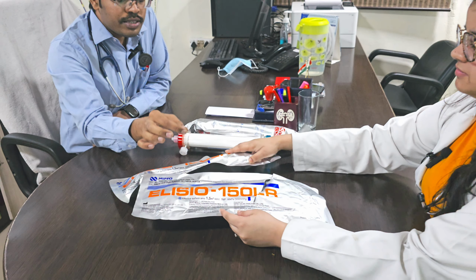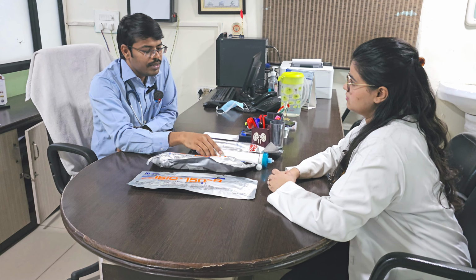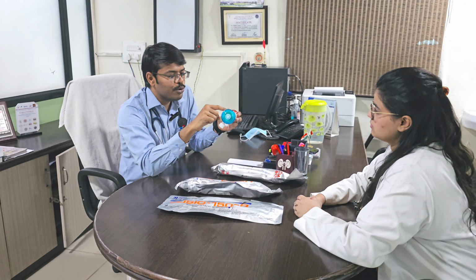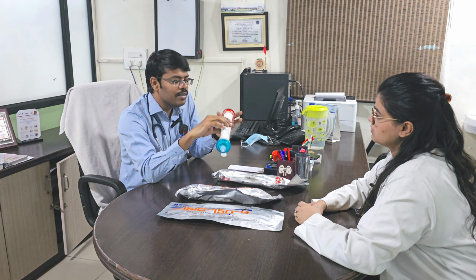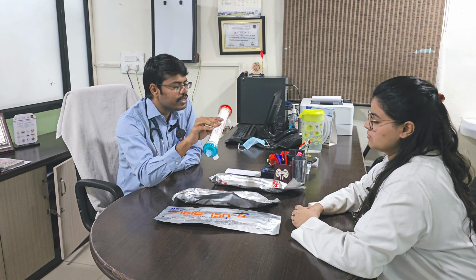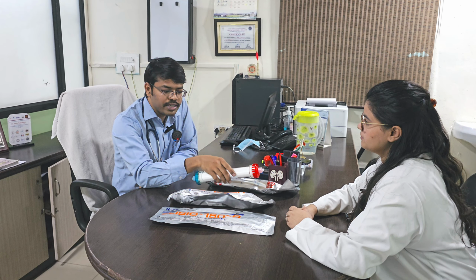Then an important question you might encounter here is: what is the other name for the dialyzer? It is also called a hollow fiber artificial kidney, because it is hollow and contains multiple fibers. So that is why it is doing half of the function of the kidney, mainly filtration and excretion function. So that is why it is called a hollow fiber artificial kidney.